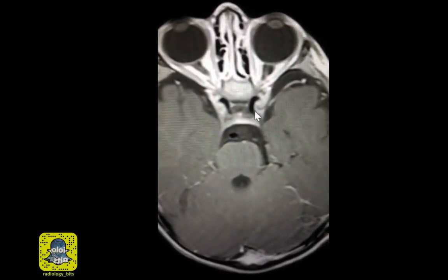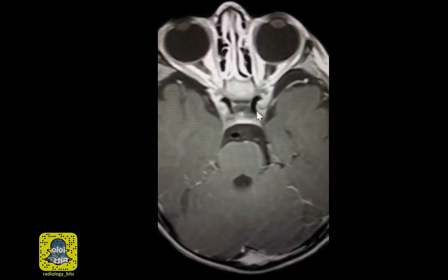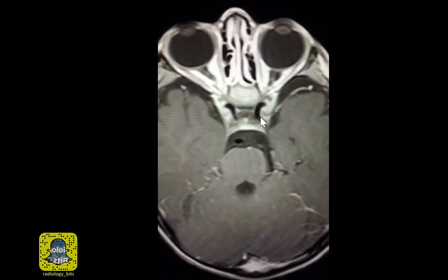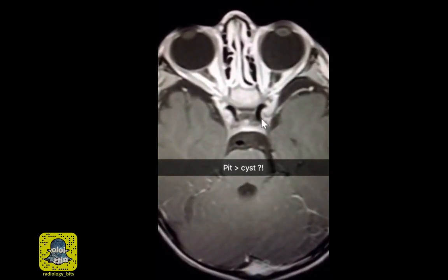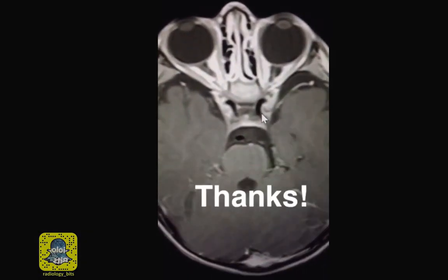For juniors, you could look at the orbits using MR using the same techniques we talked about with the MRI of the head. You could do multiple planes, you could do T1, T2, with or without fat saturation. You could also give contrast. For juniors, if the clinical request is an optic nerve disc pit, look for an optic nerve sheath complex cyst.